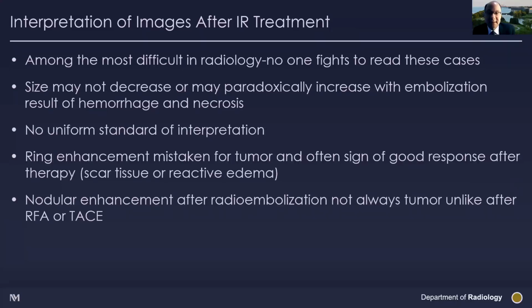Also, it's important to recognize that nodular enhancement after radioembolization is not always tumor, unlike RF ablation or chemoembolization, when we generally suspect that it's tumor, and we go back in and have them retreat the patient.